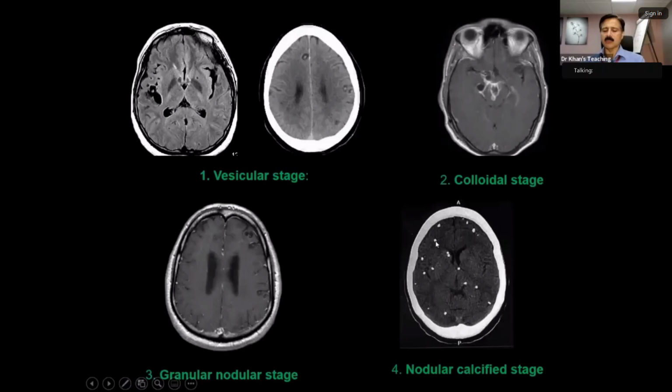So the examiner can simply show you this on an SWI sequence, and you will be saying, oh, is this microhemorrhages? And actually it will be small calcifications.